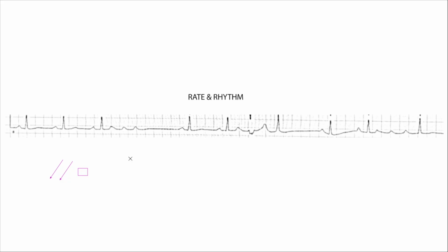Now, this looks like a very confusing, all over the place kind of an ECG, especially if you're new to this ECG interpretation world. And there's a lot of bizarre stuff going on here, right? The first thing that really stands out is this big hole here. There's this big hole with these little weird-looking waves there. There's an odd beat right there. There's another little pause, or at least it looks like a pause, right? And then we get another set of these waves over here.